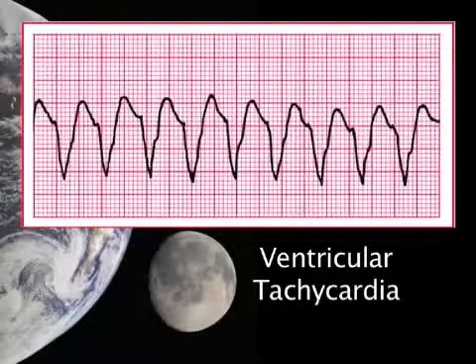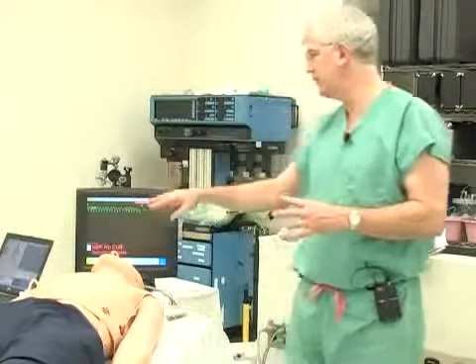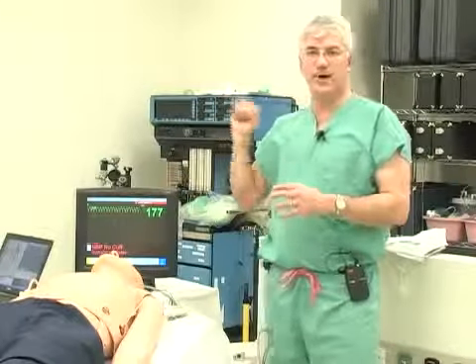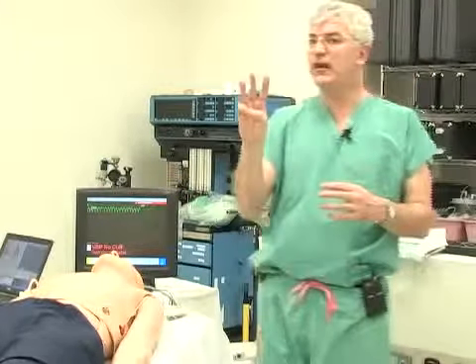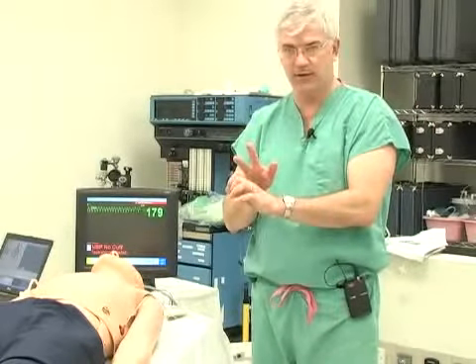The next thing we're going to talk about is VTAC, and we're going to take on pulseless VTAC. First, a word about VTAC. Remember, there are 3 flavors of VTAC. When you see this rhythm on the monitor, remember there are 3 different kinds of VTAC. There is pulseless VTAC, which we're going to take care of first.